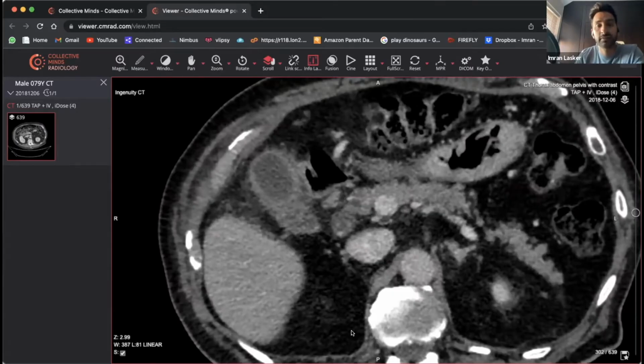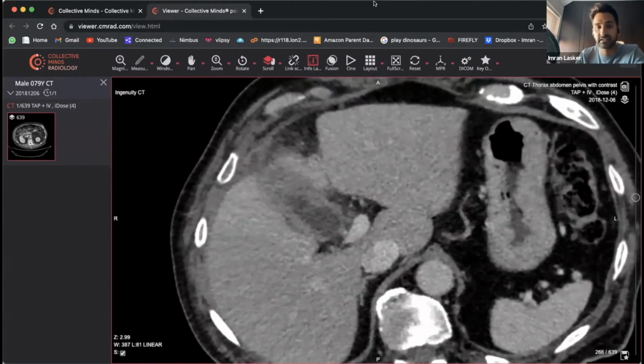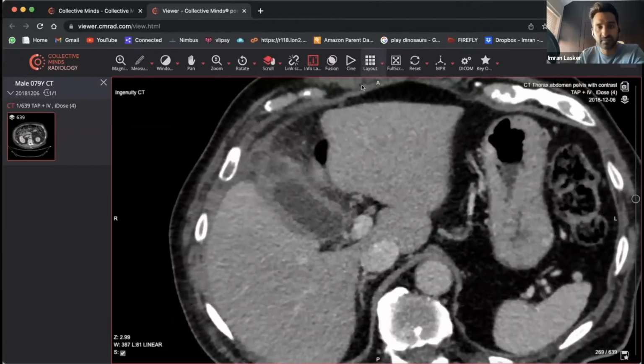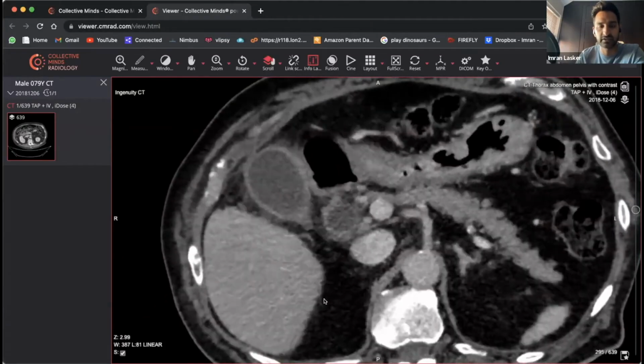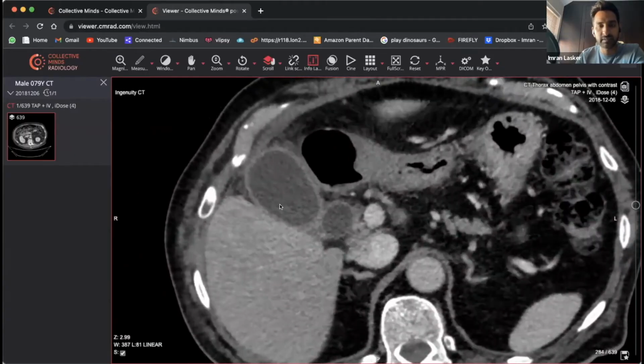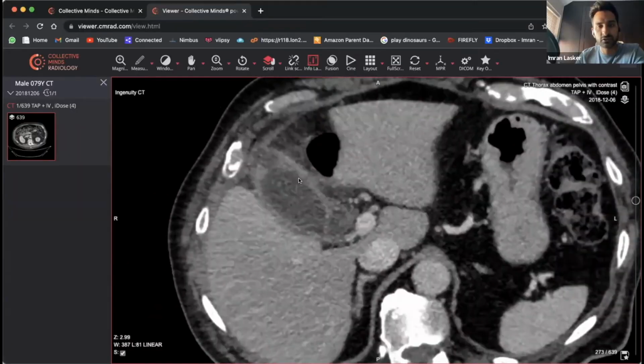And so you may have something that's isodense to the fluid, hypodense to the fluid, almost isodense to the fat, or you just may not see anything at all, but there still could be calculi that is causing some kind of obstruction. Sometimes you feel a little bit of irregularity going on within the liver, within the gallbladder. But on this one, maybe possibly there's some lower density within it, but you can't be 100% sure. But you've got the gallbladder sitting there.